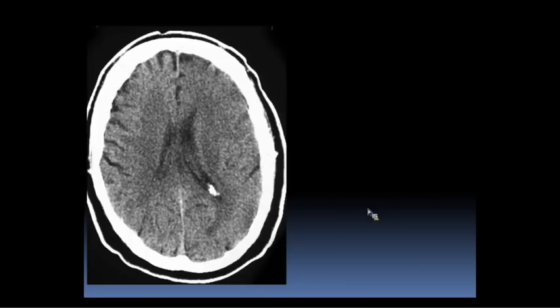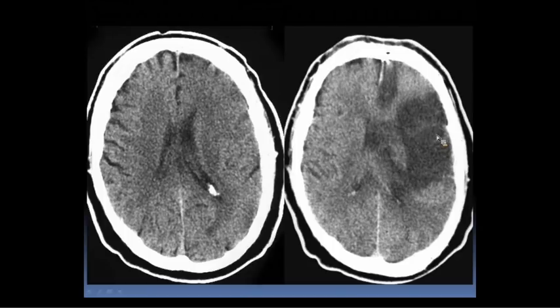So this is not just an MCA, because here, clearly there's some MCA. You have this frontal area involved, but the MCA territory does not go all the way medially here, right? So this medial strip here is actually the ACA territory, and this is a little bit later, maybe a week later, and we see this much more well-defined here, clearly an MCA stroke here, but we also have the ACA territory. So that medial strip that's parasagittal in the frontal, to the anterior parietal, is all ACA territory.